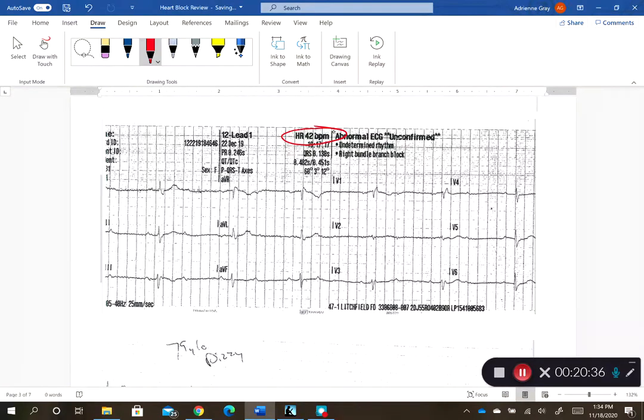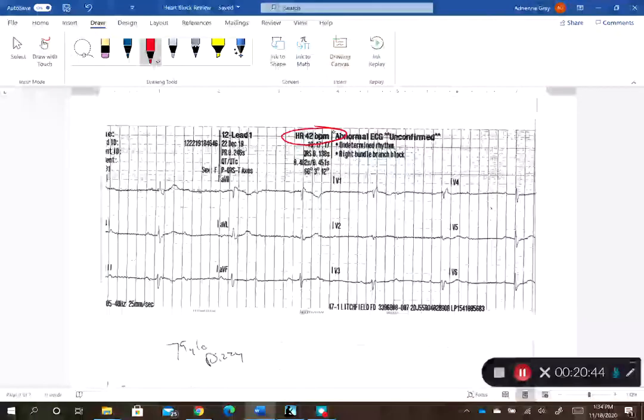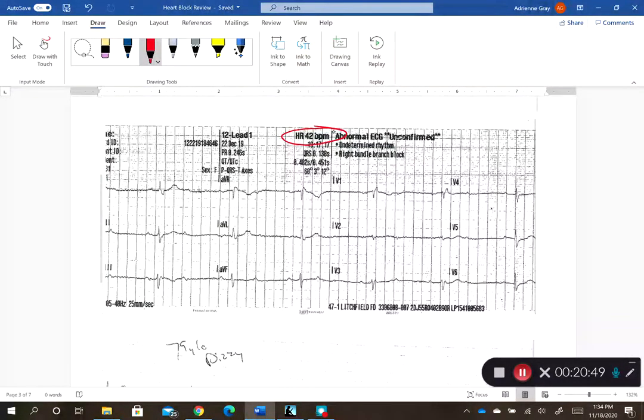And let's go ahead and circle my P waves. So this is a 12 lead, all right? So we're showing 12 different areas of the heart. So our P waves and our QRSs may change morphology a little bit as we're going through. I'm going to look at this bottom line down here because for me it looks like it has the least amount of artifact, and I can pick out these P waves pretty well.